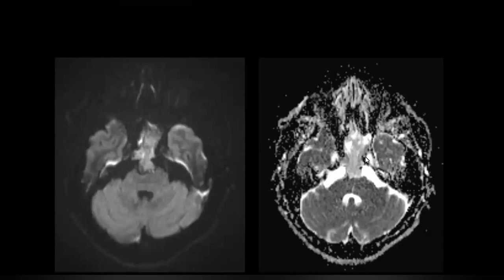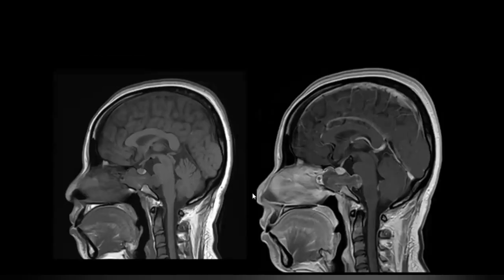This next feature is very particular. You see here it is causing an impression on the pons. This is called the thumb sign. Have you heard of that? It is like a thumb pressing on the pons. Have you heard of that term? Yes, sir.